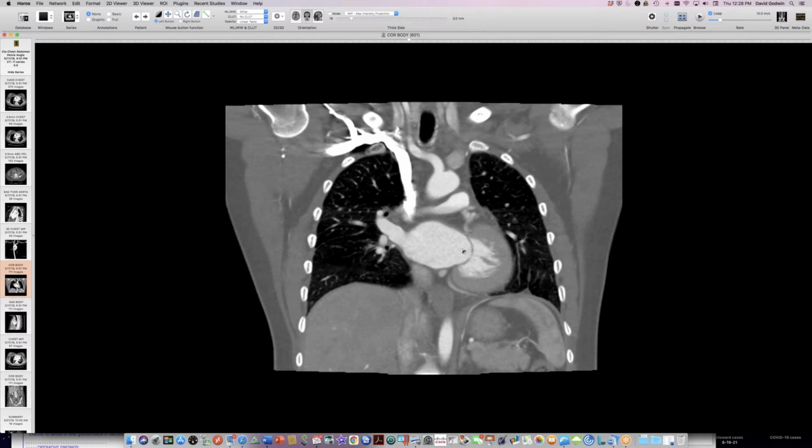Geleophysic dysplasia. It's mostly a skeletal and a facial syndrome. Not if it used to have an eponym before, like Noonan syndrome or one of these things. I've not heard of that. Is the short stature because of long bone problems? I can't see that humerus all the way, but her thoracic cage looked pretty decent. Her chest radiograph was not strange looking either. She's small, but she seemed to have normal proportions on her chest radiograph. I haven't looked for long bones in her film record.